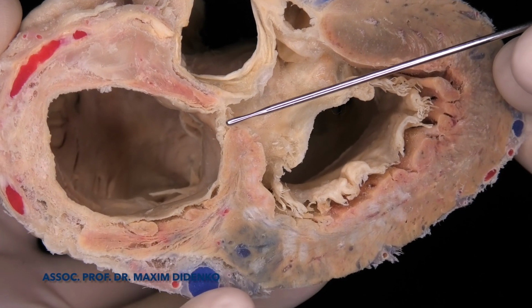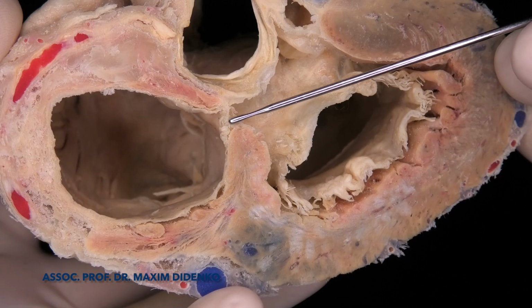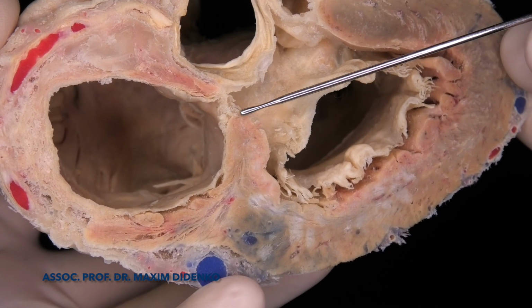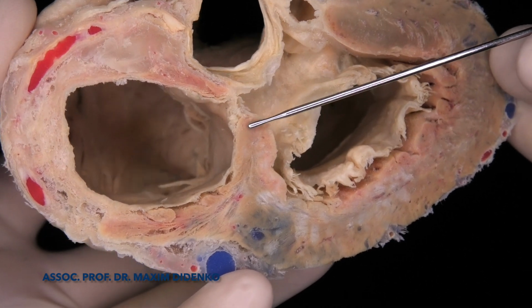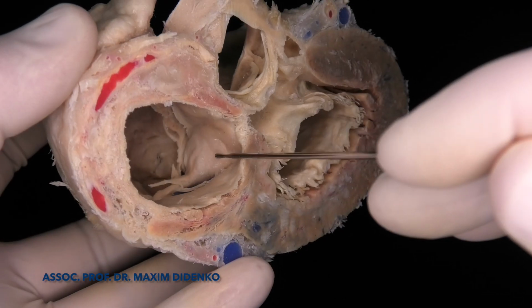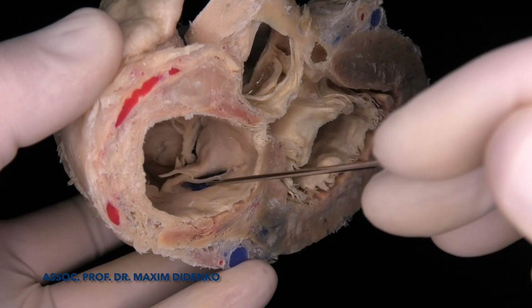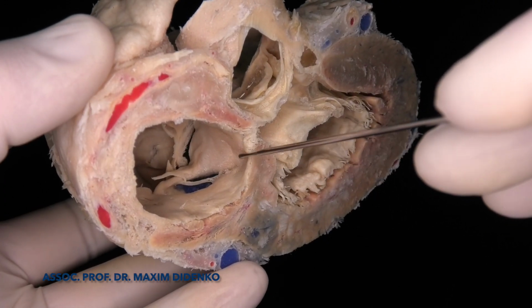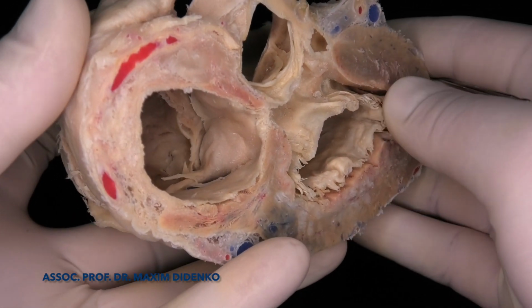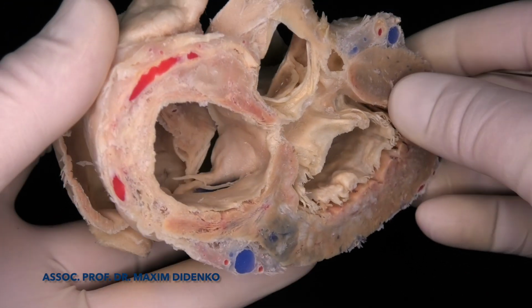As we already discussed, the His bundle is located here in the lower part of the membranous septum, in between the membranous septum and the muscular part of the interventricular septum. Here we can see the tendon of Todaro and the Eustachian ridge, coronary sinus, and tricuspid valve annulus. This is our Koch triangle, and the compact part of the AV node is located just below the His bundle.